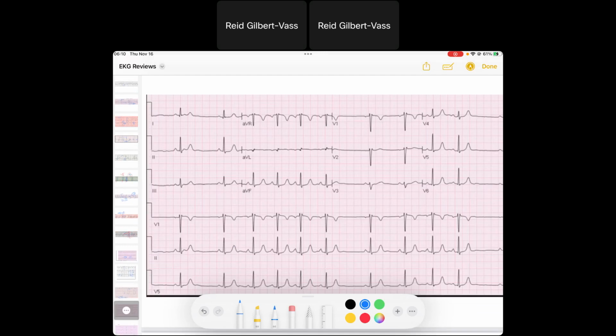Alrighty. So here we've got beat, beat, beat. It's kind of normal, and then we've got a pause, beat, beat, beat, beat. So you're like, well, what is this pause from? You get a pause there, maybe a pause there. It looks like longer and longer, and then shorter and shorter, and then longer.